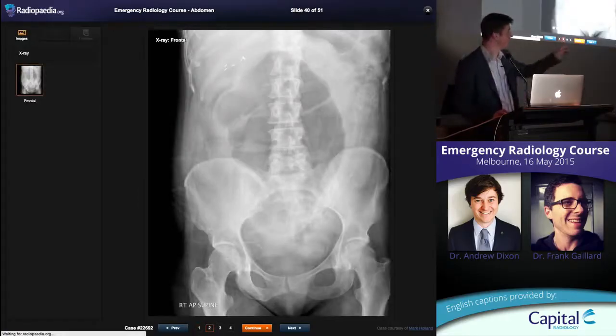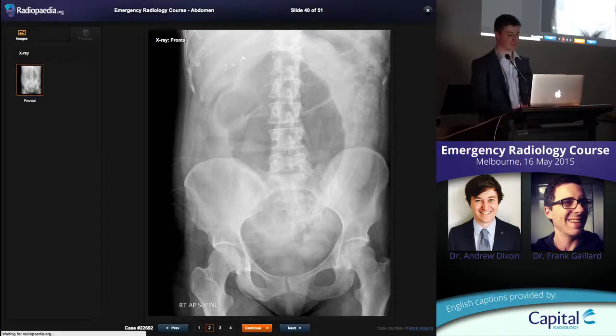Abdominal pain and distension. Last little thing before we have lunch is the large bowel obstructions. This is a very big, distended viscus sitting centrally within the abdomen, okay? You're all going, oh, is this a cecal volvulus or a sigmoid volvulus? If your cecum twists on itself on its little mesentery and distends up like this, no gas is going to get past it, so you're not going to have distended large bowel distal to it. So you can see in this patient there's no real distension of the rest of the large bowel. See the descending colon here, a little bit of feces in it, but no distension. So that's a good sign that we're talking about proximal large bowel that's distended here.